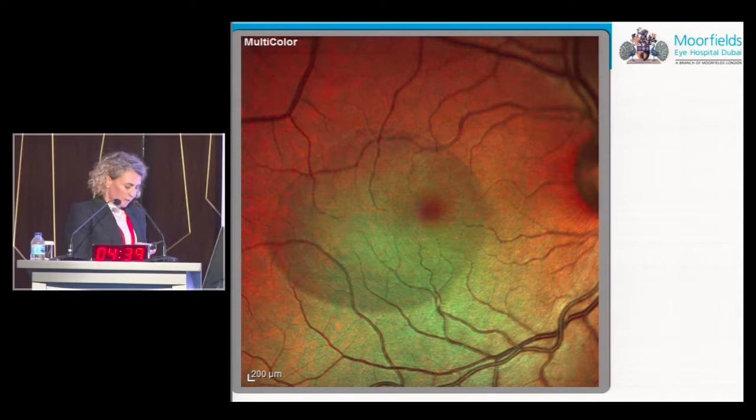You can visualize fluid very well. And fluid shows up, obviously you can see the demarcation of the fluid, but interestingly, the aspect of the fluid is bluish-greenish. And the reason is the one that I said at the beginning: because the infrared light gets absorbed by water, what you're left with when there is water is basically the blue and green light.